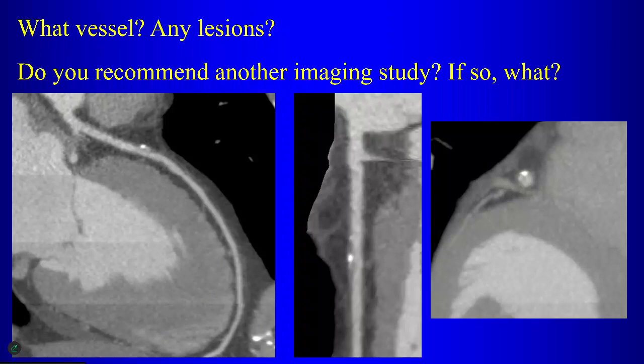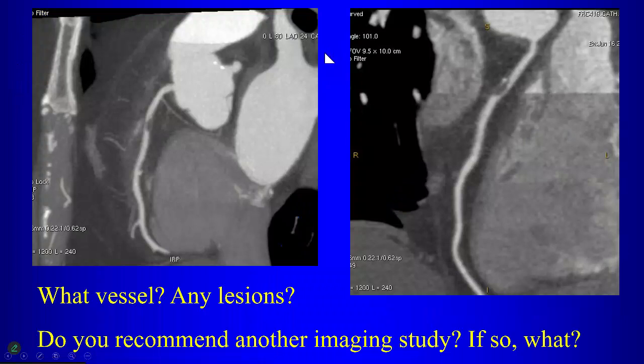Do you recommend another imaging study for this patient, based on the results that we have on this study? Yes or no? No. No, you would not recommend another study. So coronary CT in this case with a less than 25% stenosis, if this is the only lesion, if this is the only abnormality, this patient does not require any other workup for coronary artery disease.